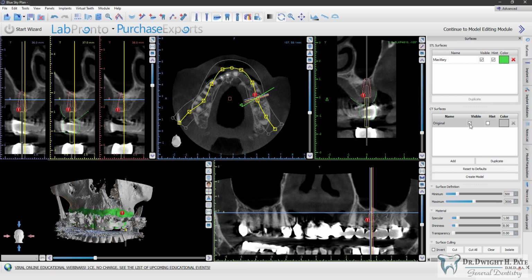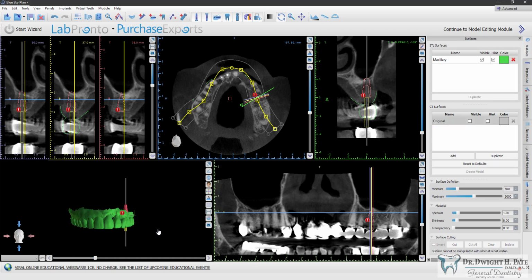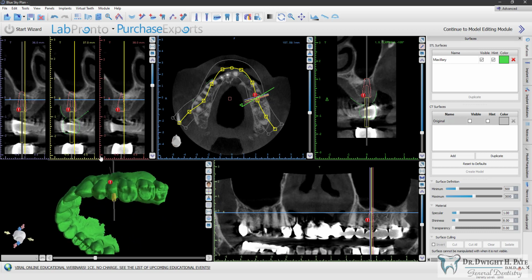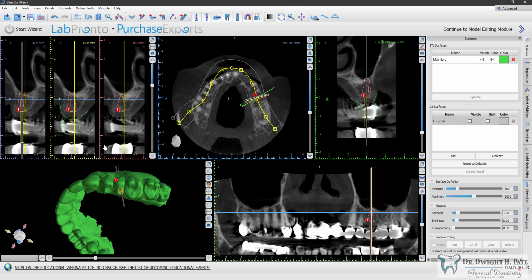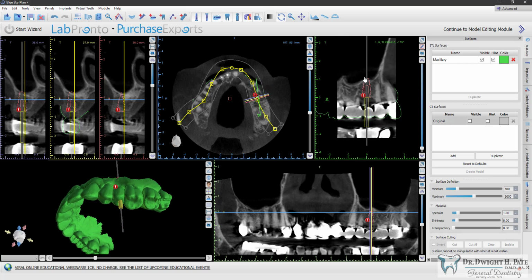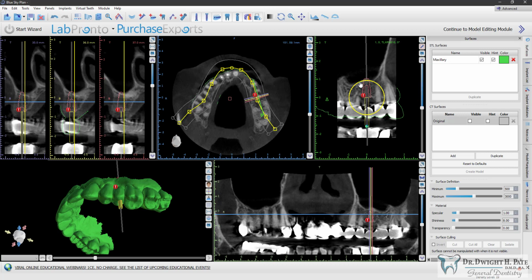But with this, you can see exactly where the implant lines up within the bone, and you can follow the projection through the prosthetic. Of course, her natural teeth, where they're located now, is my prosthetic projection, or wax up, if you will. And so that's what I want to align to.